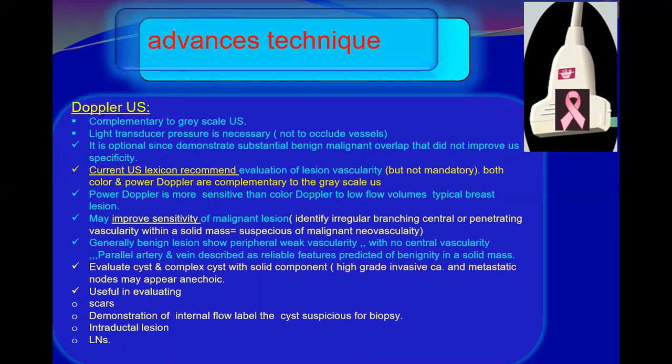Excellent. To see the vascularity of a suspicious lesion. Doppler is complementary to the grayscale.